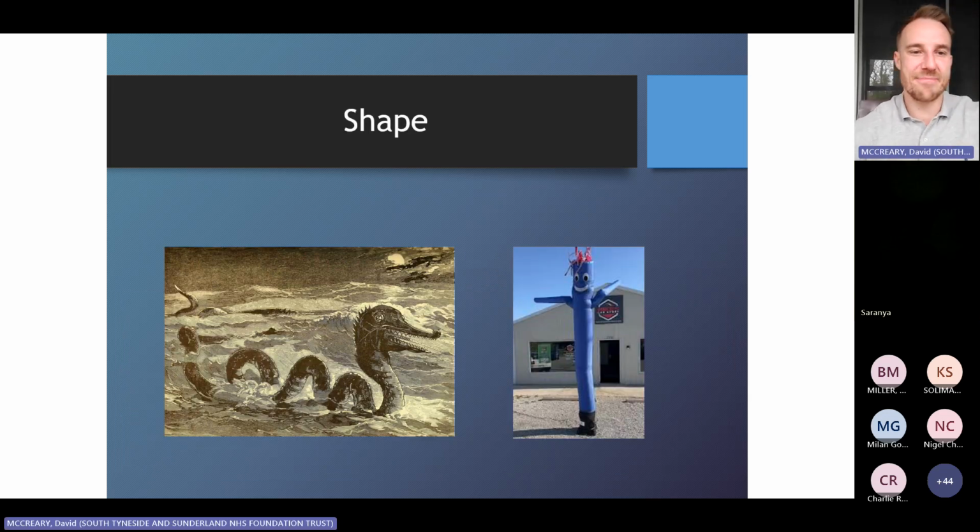Okay, shape. Really interesting this. Most of the time I would say, and there are some surgeons in the group, so I'm not going to embarrass myself, on scanning the normal appendix will look fairly curved and curled. It will look serpiginous, sometimes with as many as 4 loops, where we see a root, middle, tip, something like that. I've seen that 3 or 4 times. When it gets inflamed and problematic, it blows up into a straight shape like this and becomes thick and turgid, non-compressible, obviously. This inflatable guy fits with my brain about what would happen to the appendix.